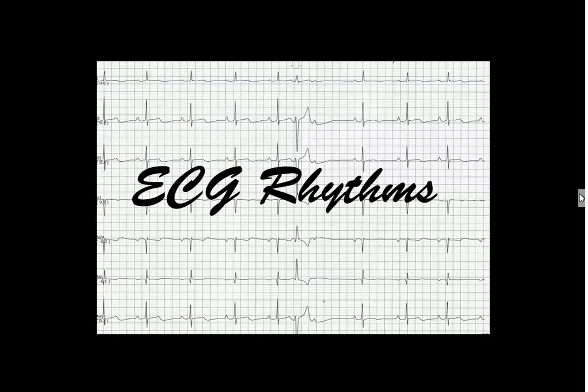Hello. In this post, we will look at a strip with two rhythms. Can atrial fibrillation be regular? Yes. This can happen in atrial fib with AV block and in atrial fib with AV dissociation with junctional, subjunctional, or ventricular rhythm. Even rarer is AFib that is regularly irregular.